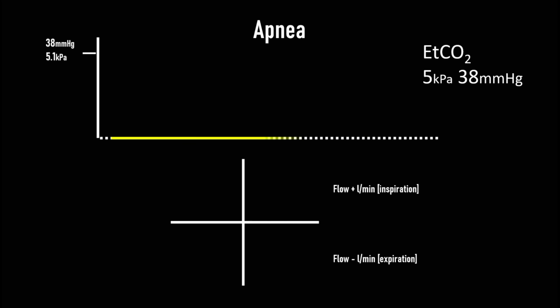Note that when the patient becomes apneic, the end tidal CO2 number stays displayed on the screen for at least 30 seconds while there are no flow or CO2 waveforms, and nothing changes until the apnea alarm goes off.